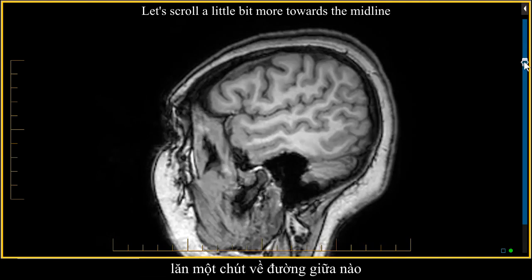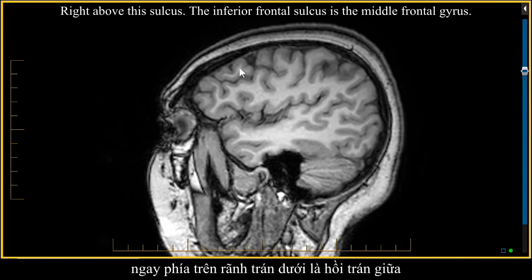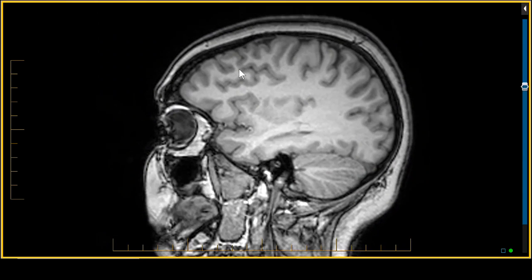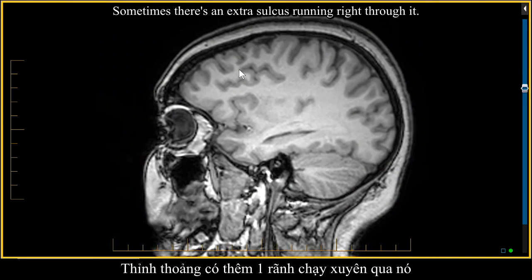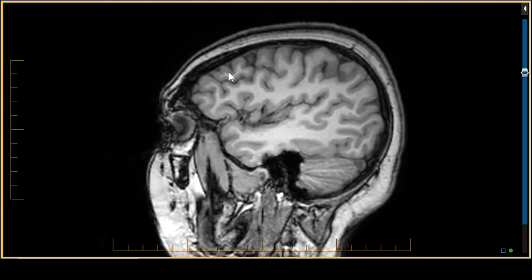Let's scroll a little bit more towards the midline. Right above this sulcus, the inferior frontal sulcus, is the middle frontal gyrus. Now the middle frontal gyrus can be divided up into two. It's the thickest of the frontal gyri. Sometimes there's an extra sulcus running right through it. We don't see that here right now.